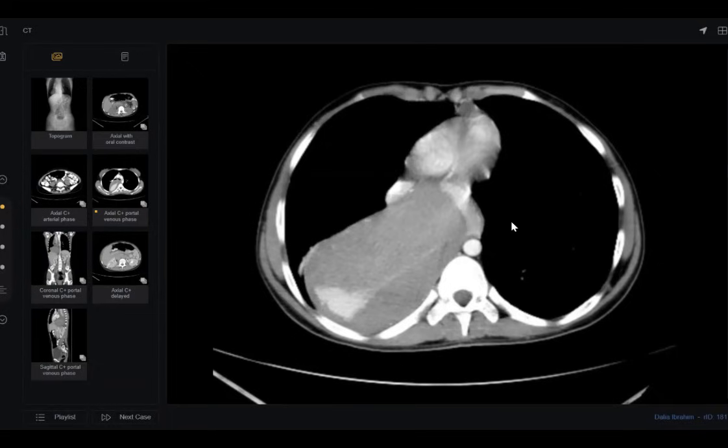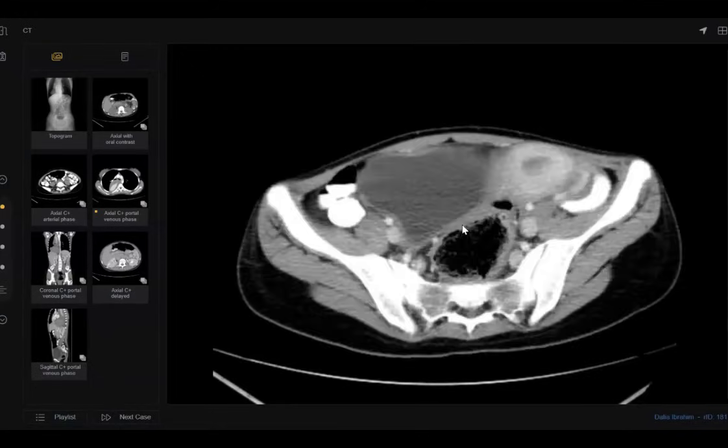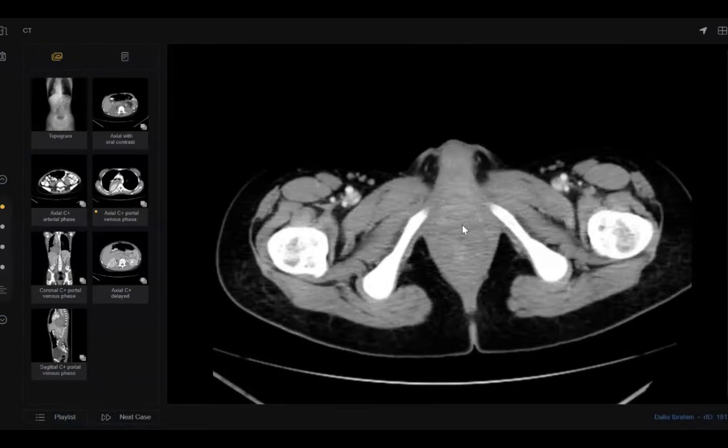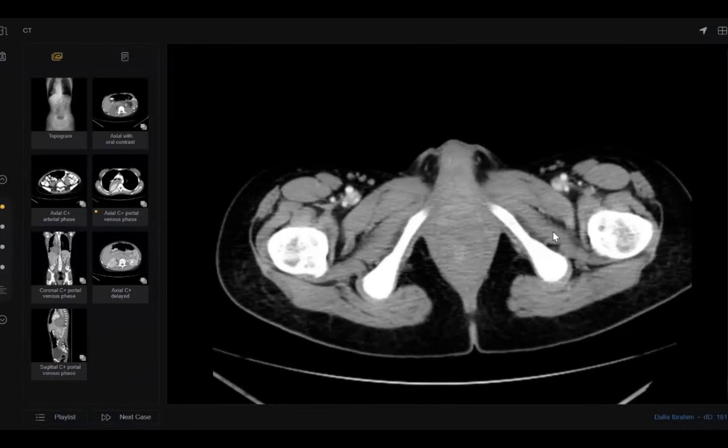Apart from this, because I'm not able to see the stomach, I was not able to see the normally placed fundal gas. So it could be a result of some gastric pull-up surgery if the patient has undergone it. Look here. Could you find anything here? What do you think?